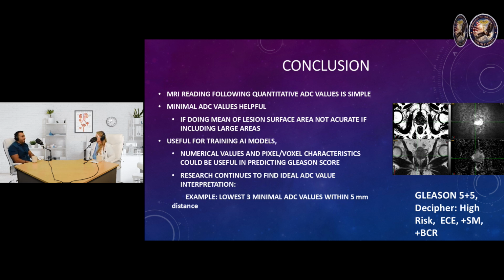But talking with you, one thing I've realized is I can look at an MRI image for one patient, obviously not my patient, I'm not a medical doctor, and spend an hour looking at it and seeing what I want to see. We have to find a way to make this a more efficient process. Yes, we do. So I thought it made sense, if we have a certain region, to plot those pixels and get a good glimpse of what the bottom half of that bell curve looks like. That has helped a lot, especially in clinical practice, to be very efficient.